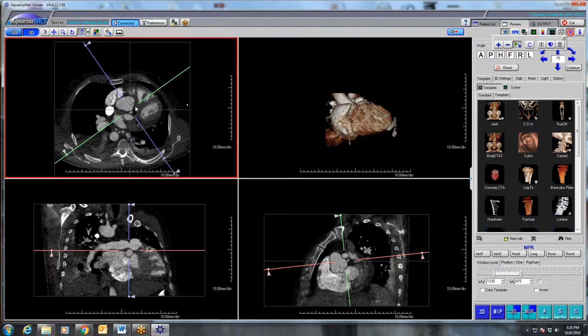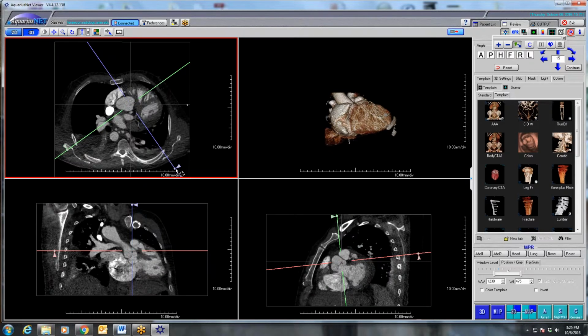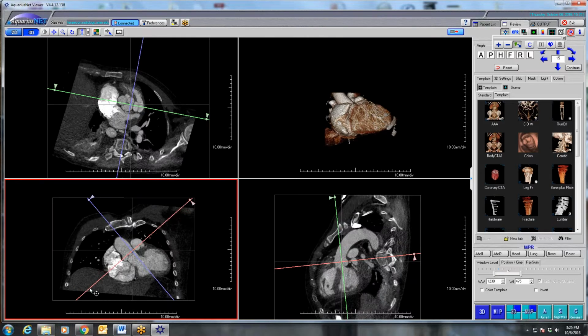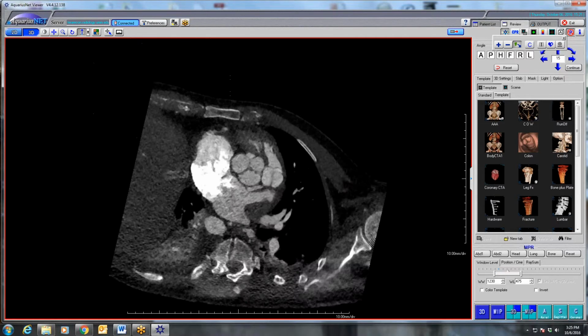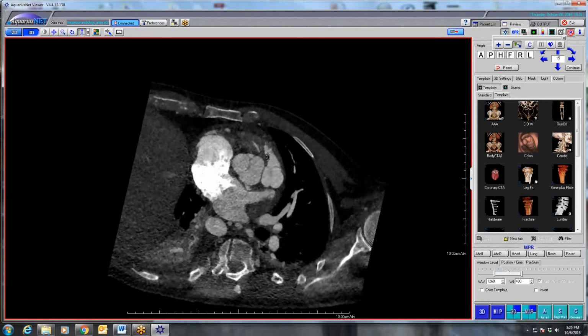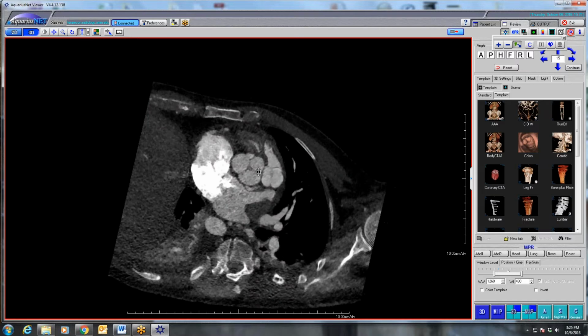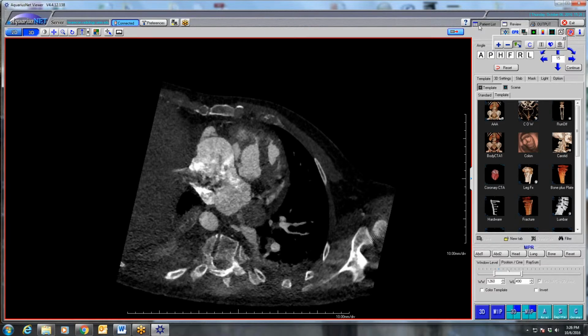And another thing to notice with any of these conal truncal rotational abnormalities is that whenever you look at the aortic root down the plane, there's going to be clockwise rotation of the aortic root, which is the basic lesion behind the whole tetralogy phenomenon. So normally the non-coronary sinus should always point between the two atria, which is here. Because of this clockwise rotation, you can see that the right, which should be pointing anterior, is a little bit clockwise, and the left is more posterior. So anyways, pentalogy of Fallot.